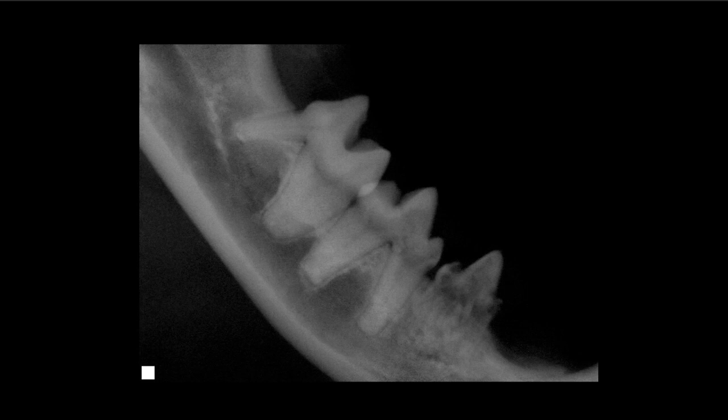You see that really nice white tip, and then you see that gray, as opposed to the molar to the left of it. So that is radiographically the same thing that we're seeing grossly with that pink, and that's where the crown is involved with tooth resorption, which might not get picked up unless you're really looking at that closely. So you have to really closely evaluate that in order to make that determination.